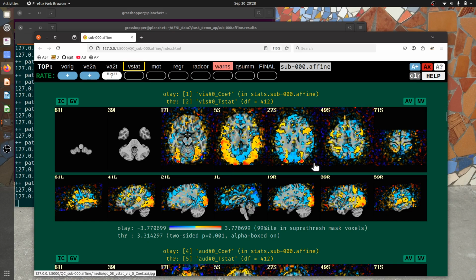And we see this kind of messy stuff around the brain. That's okay. That just gives us a sense of what the individual subject signal to noise ratio is, even in the air outside. And we see a little bit of noisiness inside the brain. We're maybe not used to seeing this in papers.